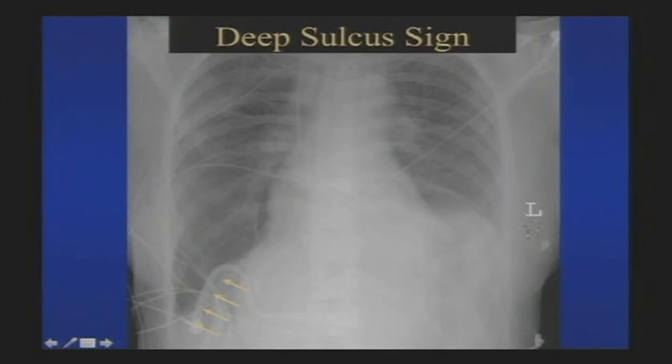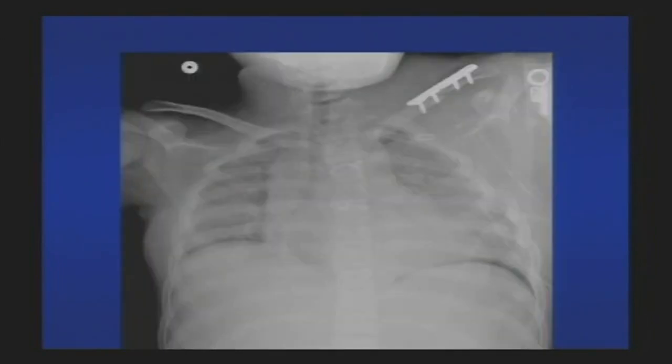So don't miss that. Sometimes you'll see patients who have just a unilateral lucent hemithorax because the pneumothorax is anteriorly layering in a supine patient. So always consider pneumothorax in any abnormality which is too lucent.